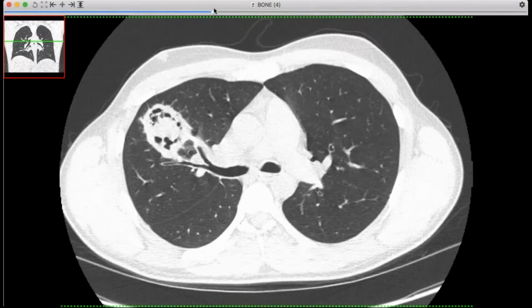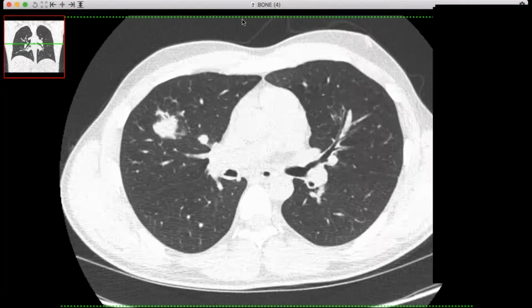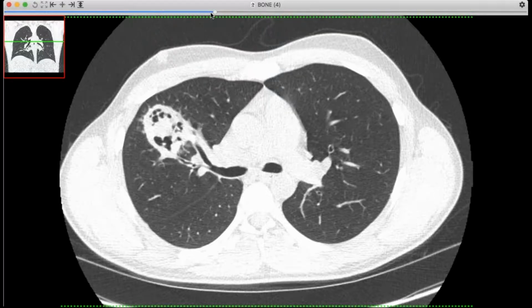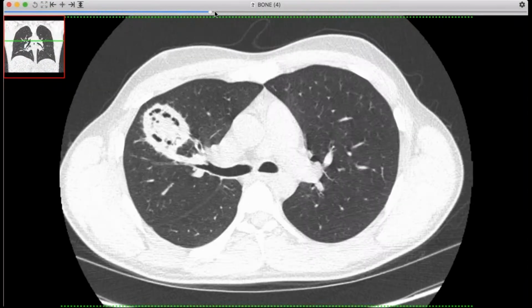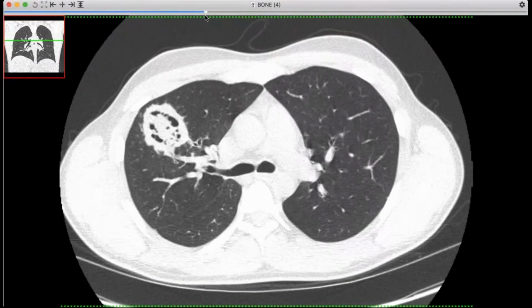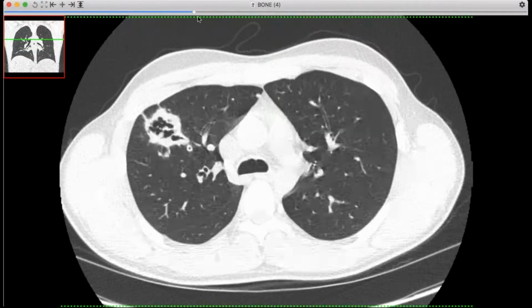So, in an older patient, you would favor this being ugly lung cancer with metastases, or maybe renal cell or something hematogenous. But he's a young guy and doesn't have a good history, but maybe something infectious. Blastomycosis where we live could definitely give you a mass like this, although the edges usually are much shaggier, and I wouldn't expect to see the well-formed nodules. I'd see more inflammatory type nodules. Mycobacterial disease, I don't like it for tuberculosis either. Again, it's too clean on the outside, and I'd like to see some more airway-centered inflammatory nodules.